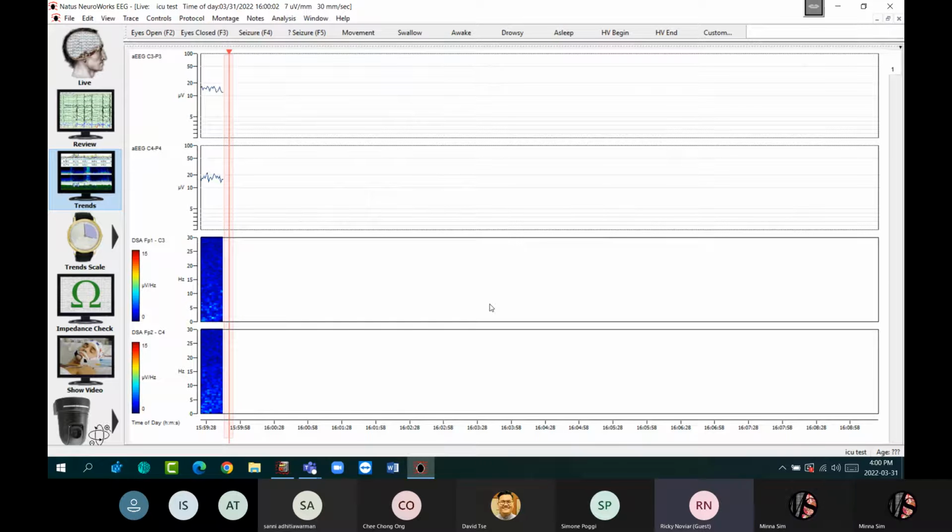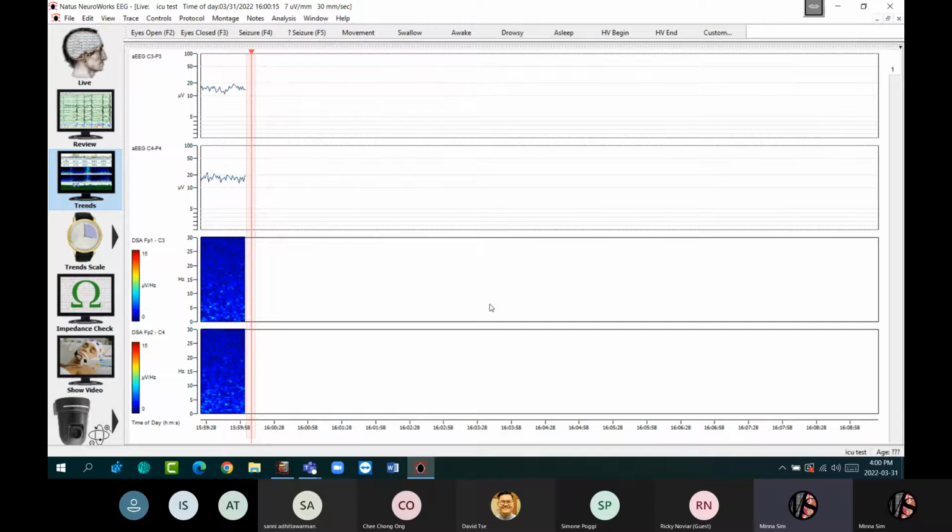For the trend profile, we must make it first, right? Yes, the trend profile and the analyzer profile, you should configure it. You can do it during the recording itself or before the recording. So just now you saw the screen automatically change to trends without me touching the buttons at all. This is the 10 seconds of inactivity. That's how it works.